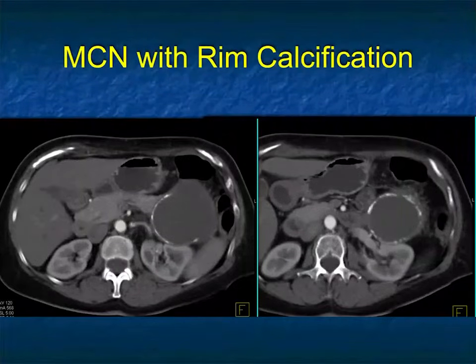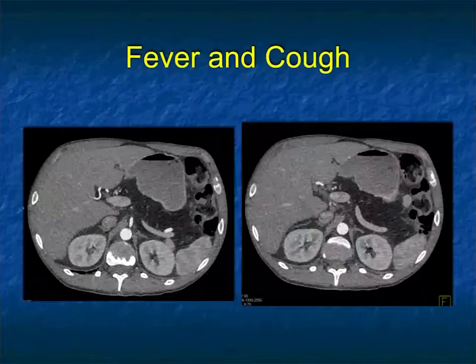And what was it? If I told you the patient was young, I would have said that it was a Spen tumor. This patient was 45, female, which is the perfect age for MCNs. MCNs often will calcify. They typically do not have dilated ducts. The appearance of calcification is variable, but this was a good example.